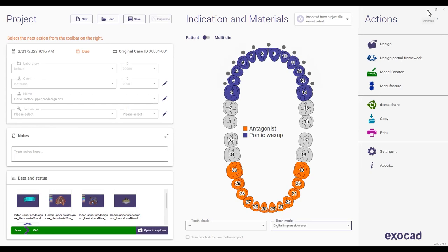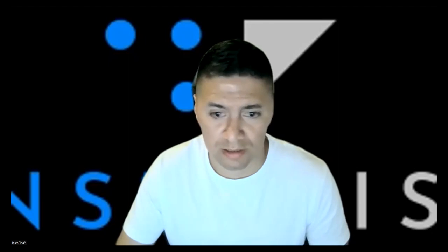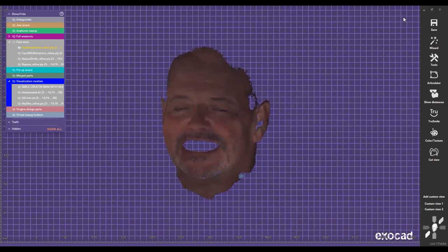So in dental CAD, let me share to make sure that I'm sharing my screen properly. So now I'm gonna cancel this and I'm gonna open this one just in case. There you go.